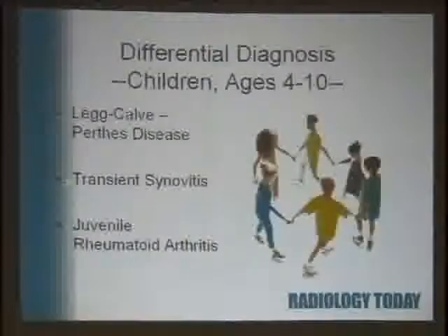Okay, now we're getting up to the bigger kids, and again, we talked about joint effusions, which you'll see you can have non-infectious joint effusions in older kids, tend to be like, I think of like 4-year-old boys. You'll see that on the hip ultrasound. Clinical data can help you decide whether you need to aspirate it. Juvenile rheumatoid arthritis, again, we hope clinical data will steer you towards the right diagnosis, but ultrasound is a good way to look at the effusion.